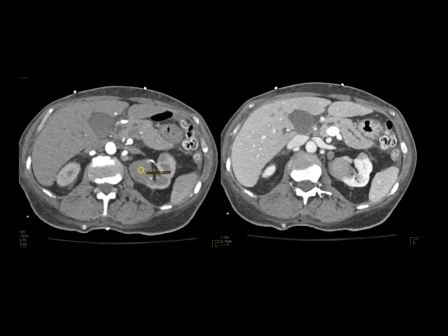Could this be a complex renal cyst? I guess I couldn't argue against that. It's indeed possible. Could this be a renal cell carcinoma that's hypovascular? Absolutely. What about B-cell lymphoma? Solid mass in the kidneys? Yes, there's really no adenopathy of note present. There are a few small nodes, but a solid mass in the kidney, you've got to think about lymphoma.